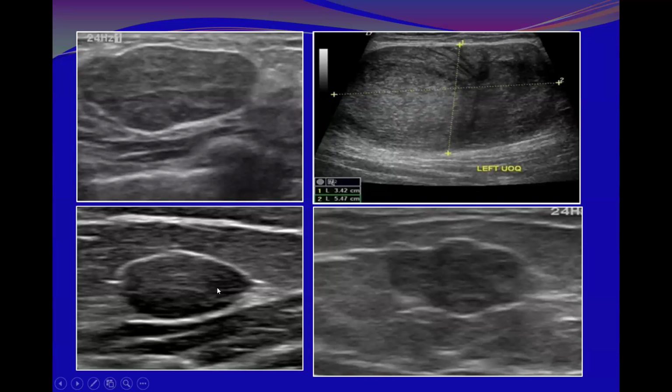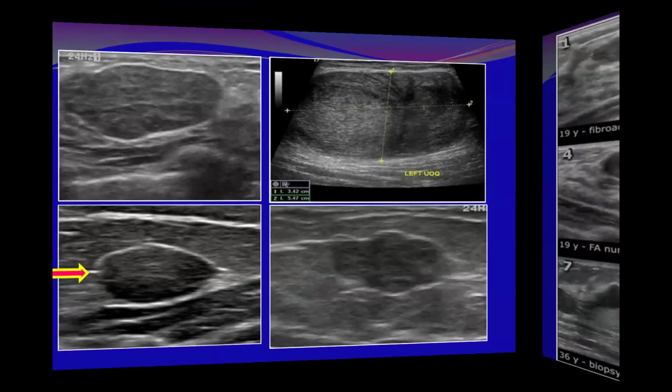And the same for this one. When I'm looking here, I have doubt about this edge. See, it looks as if it is interrupted. I have to clarify this and make sure this pseudocapsule is complete throughout, especially on the sides of the lesions.